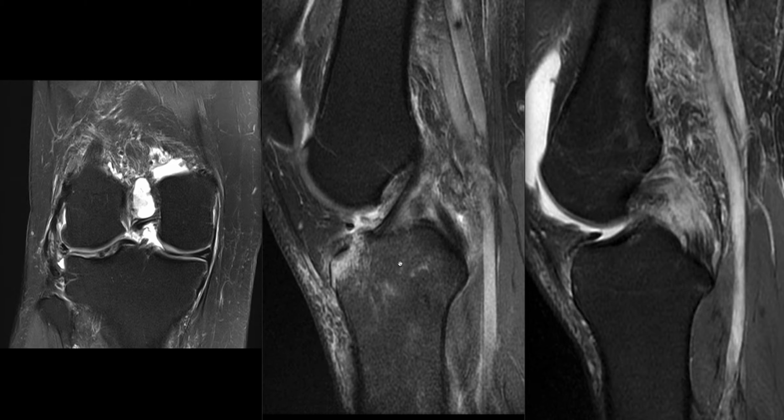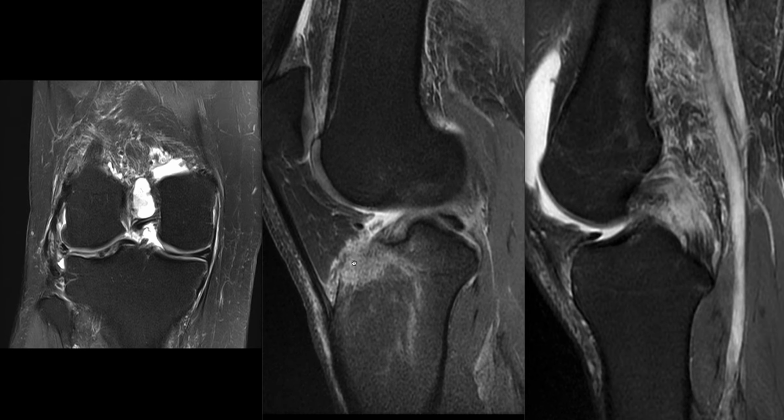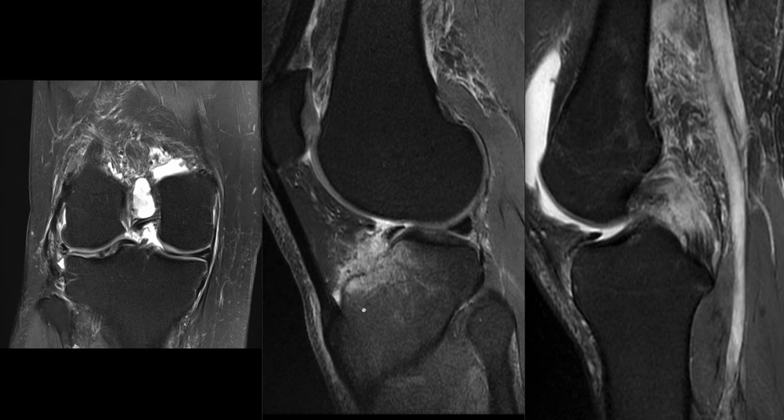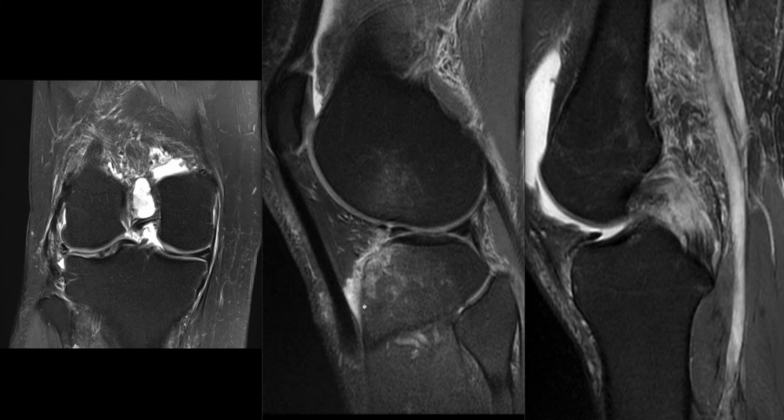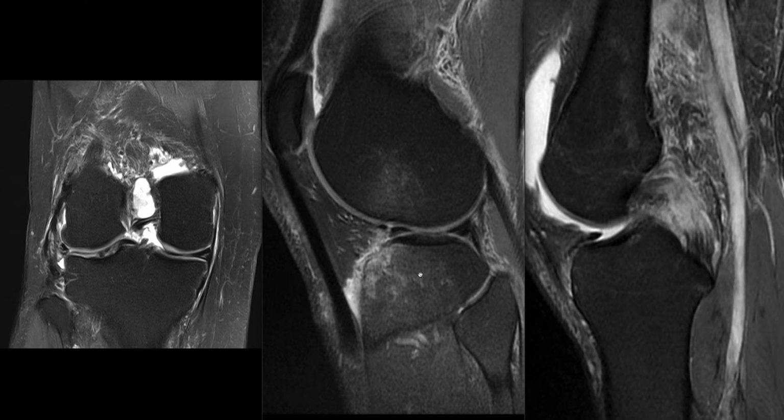And often you can tell which injury has caused the PCL rupture, either from the patient's clinical history or from the pattern of microfracture. So initially you might suspect that this is a direct impact injury to the anterior tibia in view of the fact that you actually have quite a significant compression fracture of the anterior tibial margin. But if we scan a little bit further, we can see that there's also a compression fracture of the lateral femoral condyle, almost the same pattern as a pivot shift injury.